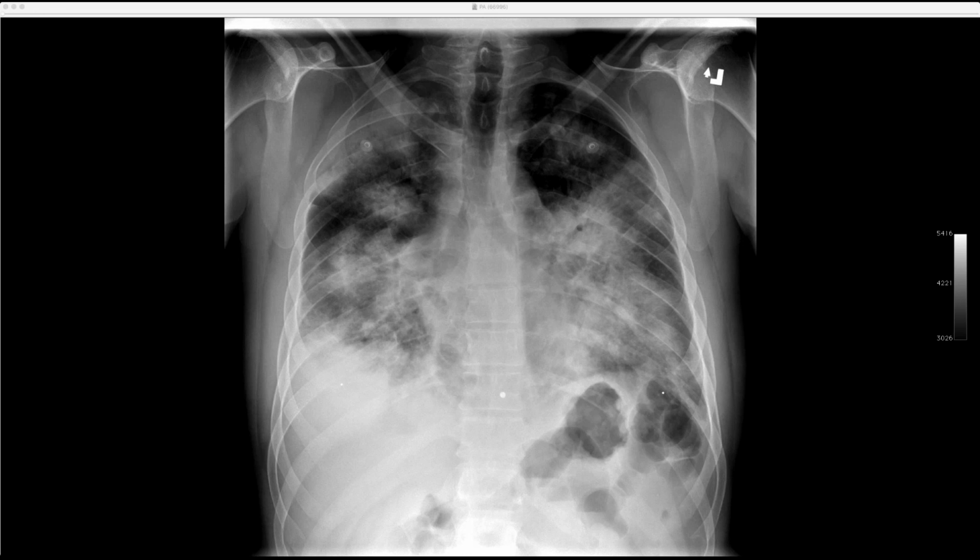Okay, and then this last case I came across. This is a young man. Let me show you the screen here. So he is incarcerated for some time. This is an old study for something at some point. He carried a diagnosis of asthma and developed sort of acute hypoxia and shortness of breath. And this was his presenting chest radiograph.